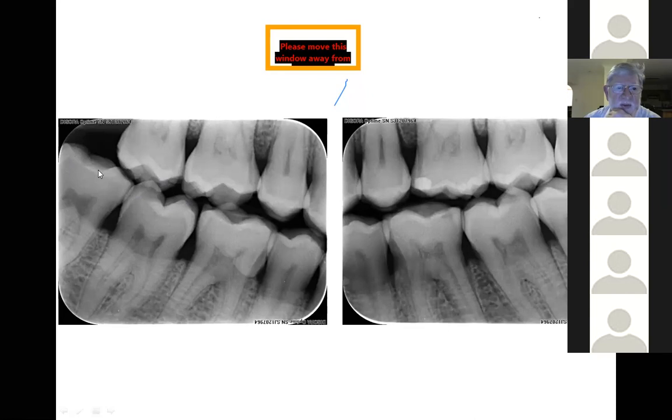Look at the amount of enamel that's being worn away in this patient's mouth, but more importantly, in the process, they are absolutely locking into each other so tightly. And this is where, if you ever needed to do restorative work for this patient, you need to know exactly where your restorations need to be, your marginal ridges. Of course, you're always guided by the adjacent tooth marginal ridge.